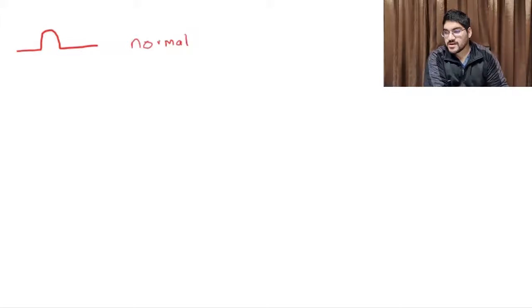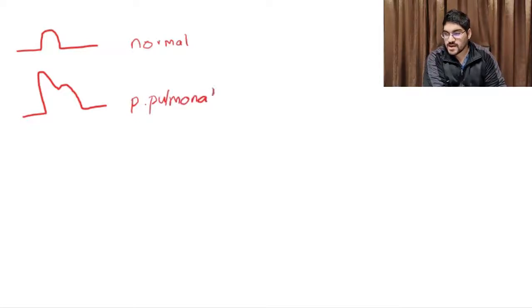Right? Now, if there is right atrial enlargement, you can actually see that in the P-wave. Because the SA node sits in the right atrium, you'll get a large peak first and then a smaller peak that's slightly delayed when it hits the left atrium. We call that a P pulmonale. Right? And that is indicative of right atrial enlargement. And because the right atrium gets the impulse slightly earlier, you see the peak is earlier, then it goes back down to normal for the left atrium.